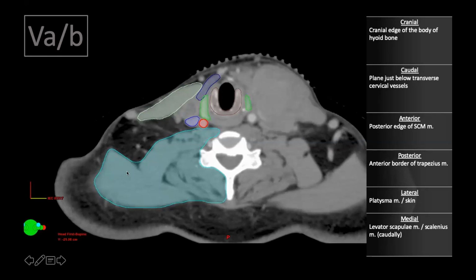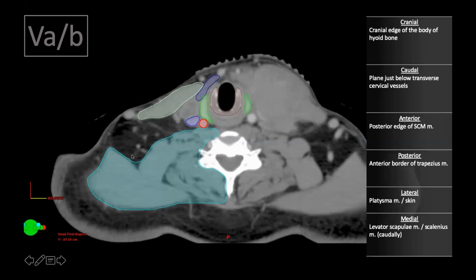But if you see the nasopharynx contouring atlas, they have included this. So basically, this goes on to mean that if you have this level 5 to be at higher risk of nodal metastasis, such as in nasopharynx, or when you actually have nodes in level 5, it may make sense to include all this space. But otherwise, when you're treating level 5 electively, you don't have to include this space, and just restrict yourself posteriorly to the anterior border of the trapezius. So you come like this.